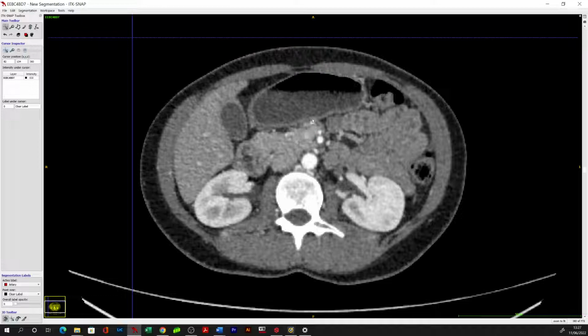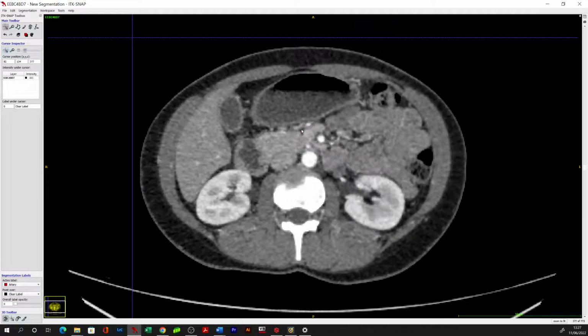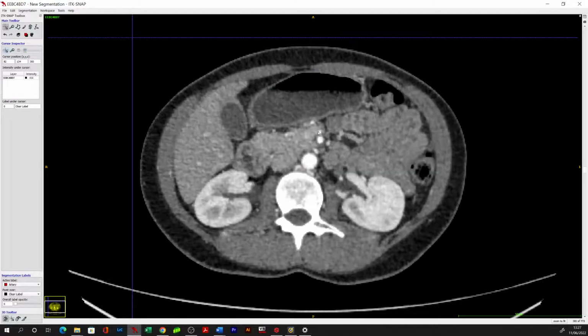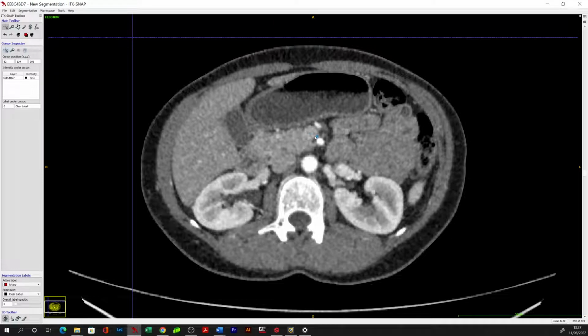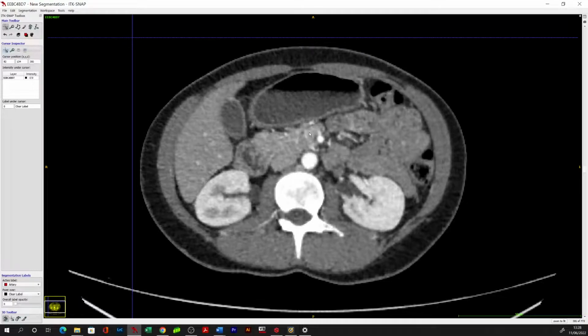So we know that the middle colic artery is here, which means that the accompanying vessel by a lot is likely going to be the MCV. And it's certainly coming out in the position you would expect. So the MCV, when it is present and draining into the SMV, usually drains off the anterior aspect, as opposed to Henle's, which you'll frequently find passing out, if this is a clock face, between sort of 10 and 8 o'clock, but typically coming off more laterally towards the right. And I suspect that this is Henle's here, although it is extremely unclear.